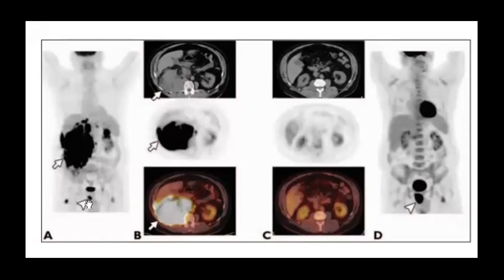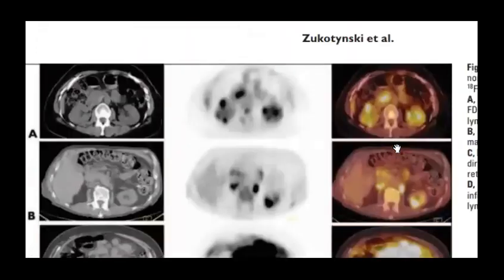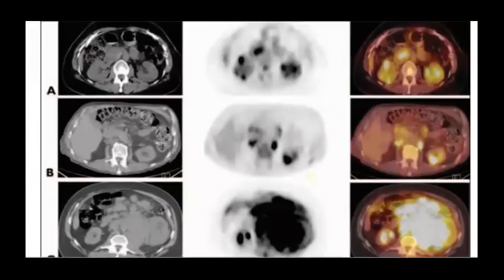And it was here, as you see, but it became bigger. Here the bladder has very small uptake, excretion, and here is a bit of a full bladder. Very tricky, so take care. And I like this type of cases because they teach something. Okay. So let's go to this case, which is a bit longer one.